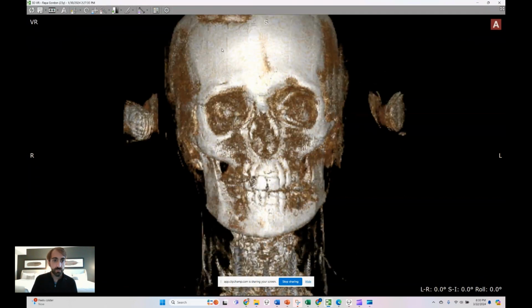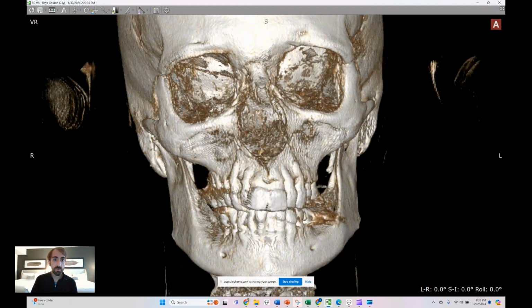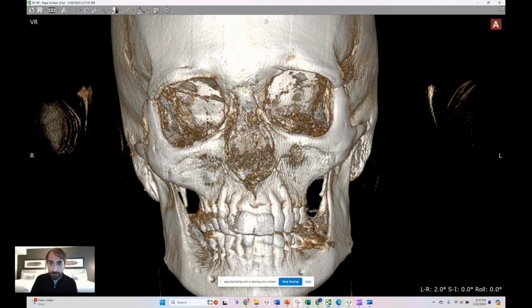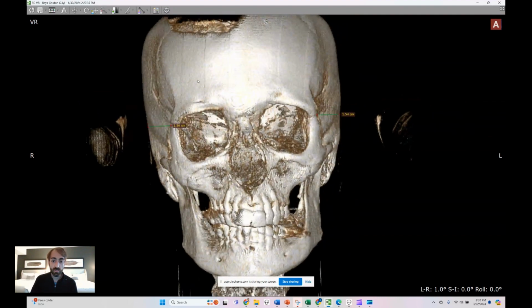And first thing we're going to do is take rotation out. So the way we do that is we measure from here to here, and we measure from here to here. And it looks like this is larger. She's probably rotated left. Let's try that. Looks like that was too much. So I think that 1 degree of right rotation will be her neutral. That looks great. Okay, so we're going to go ahead and measure head tilt.